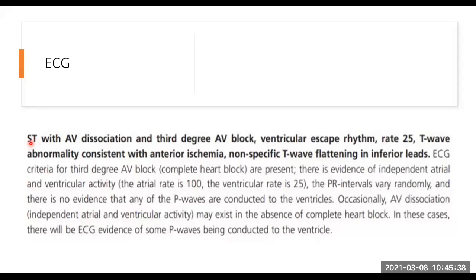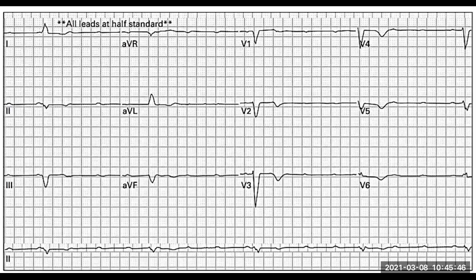So ST stands for sinus tachycardia. For those of you who had listened to previous lectures, you may wonder, because this is definitely not a sinus tachycardia. Actually, when we are being technical, when your atria are functional and consistent, we call that sinus activity. So an overall rhythm strip would be called a sinus rhythm strip. But in the more advanced books, we just look at the atrium to decide if it's a sinus tachycardia or ventricular tachycardia, ventricular brady. In this case, it's a sinus tachycardia because the sinus is going at 100 beats per minute. Just to clear up some confusion.